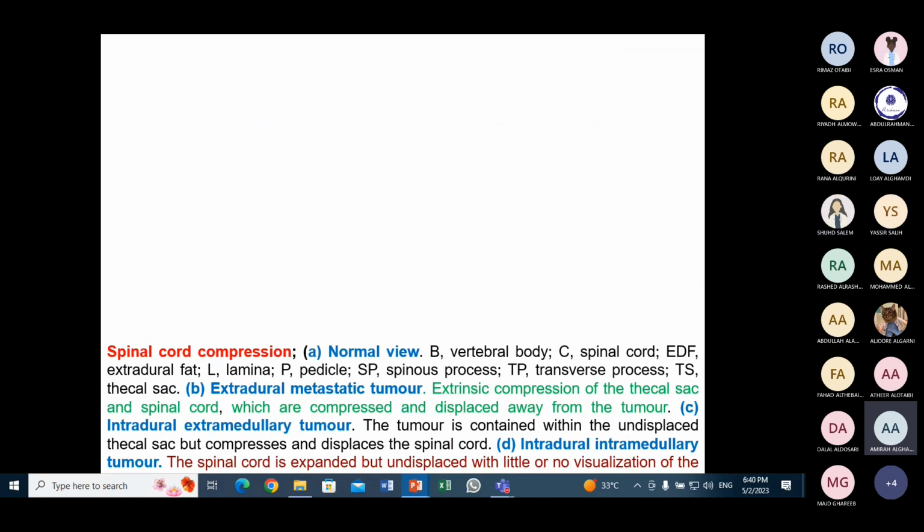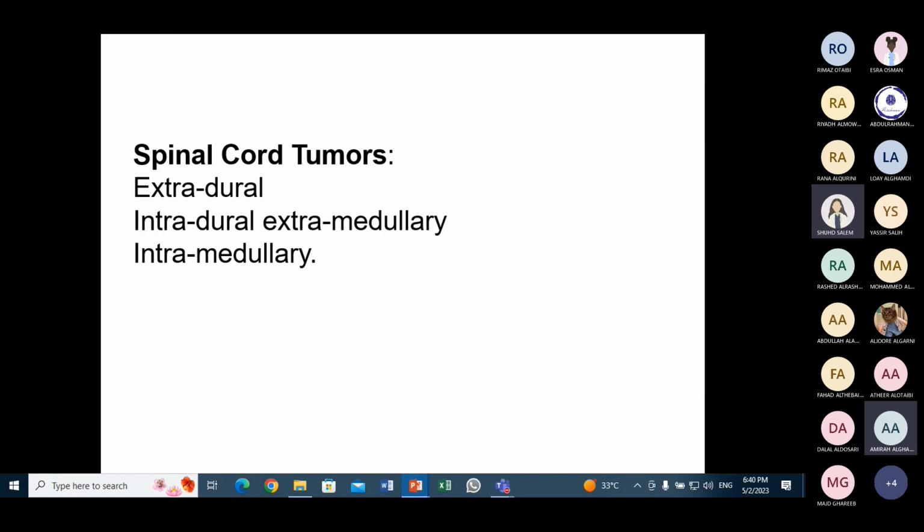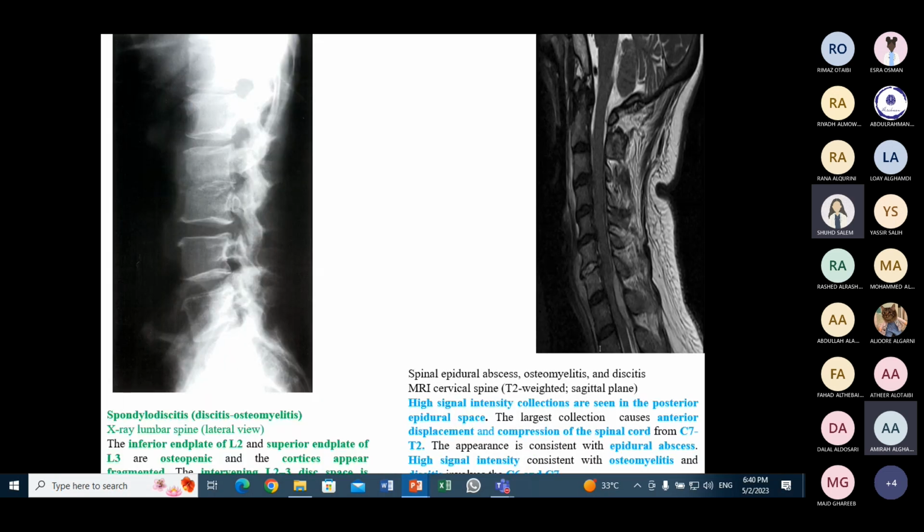Doctor, in the image on the left, superior and inferior, there are areas that are bright. Is this normal? Yes, this is not abnormal, this is a technical cause. They call it artifacts, unwanted shadowing due to technique, it's not due to pathology. It's a good observation.